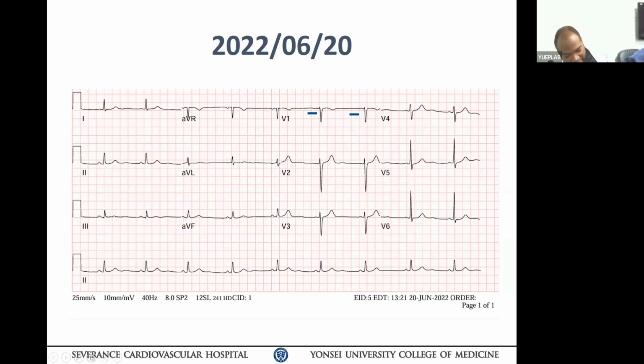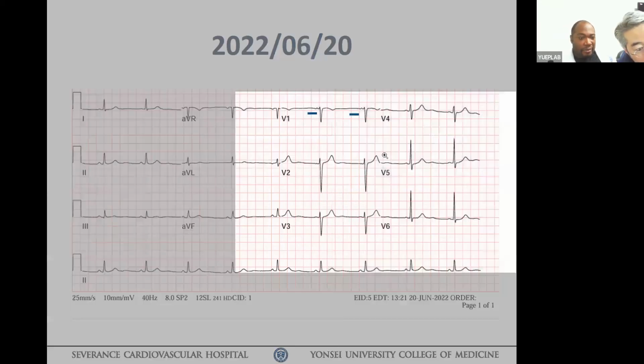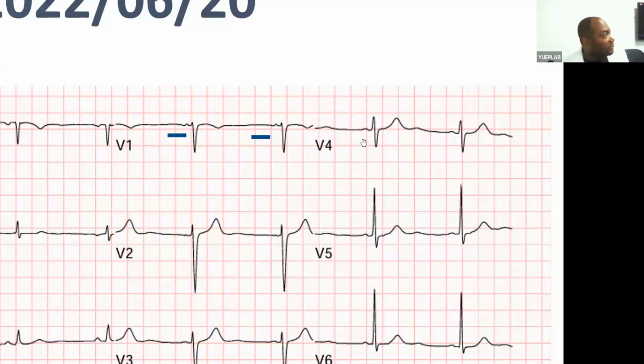So the right atrial activation cannot show up in the ECG. Generally the V1 P wave is initially positive from RA activation, and the negative P wave force is LA activation, right? If you look at this, the negative wave is much later than your marker. Nobody knows the answer, but I would argue against your hypothesis.